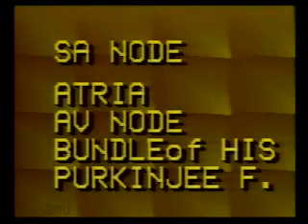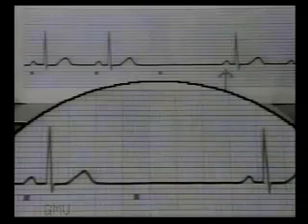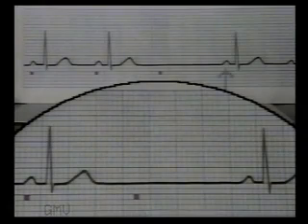But when sinus arrest occurs, the lower centers temporarily escape from the depolarizing impulses of the SA node, and one of them fires an impulse till the SA node takes over again. So if this beat following the sinus arrest comes from one of the lower pacemakers, it is called an escape beat, indicating an escape from the inhibition of the SA node.